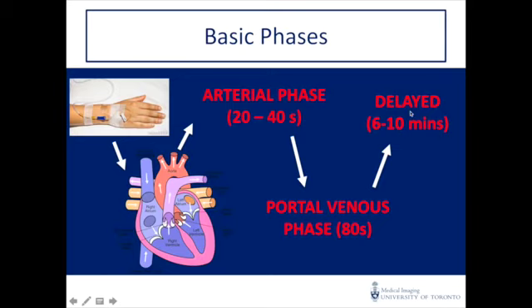By this time, the contrast has made it through the kidneys and is now in the collecting system. The delayed phase can be done for one of many reasons. One of the reasons might be to evaluate the collecting system itself.